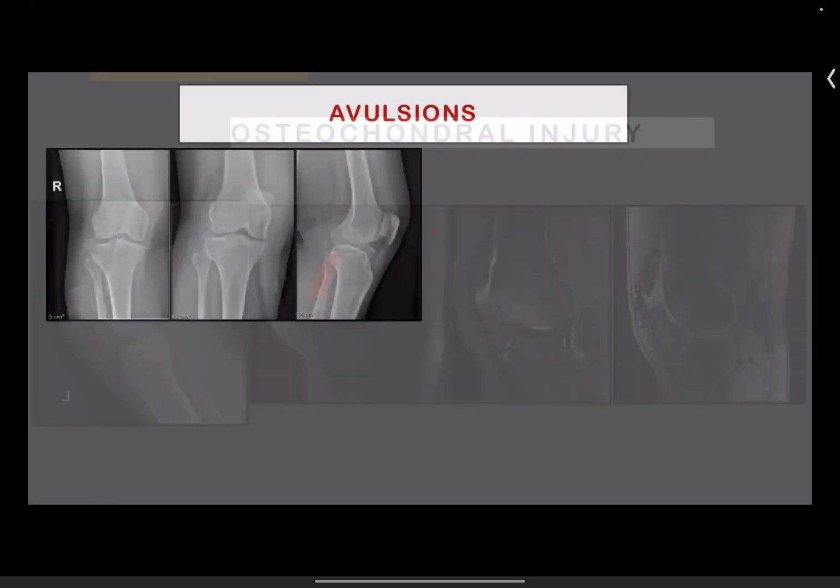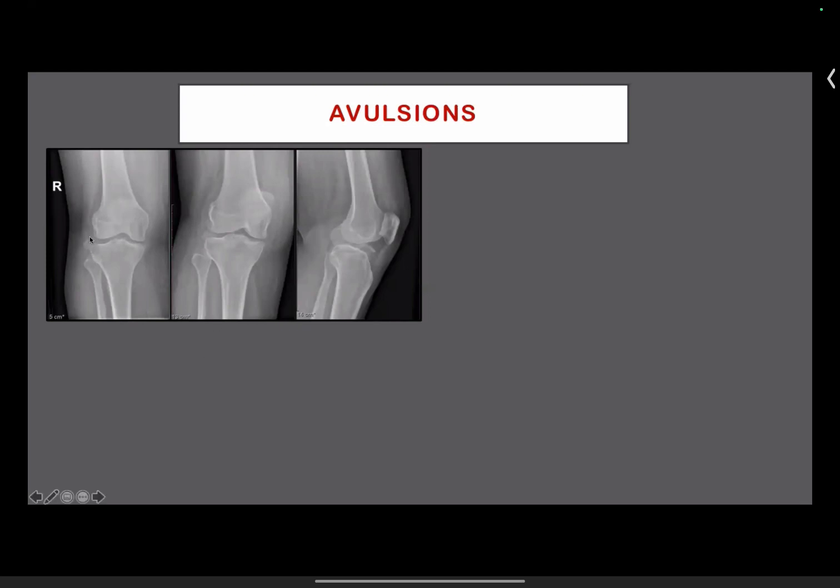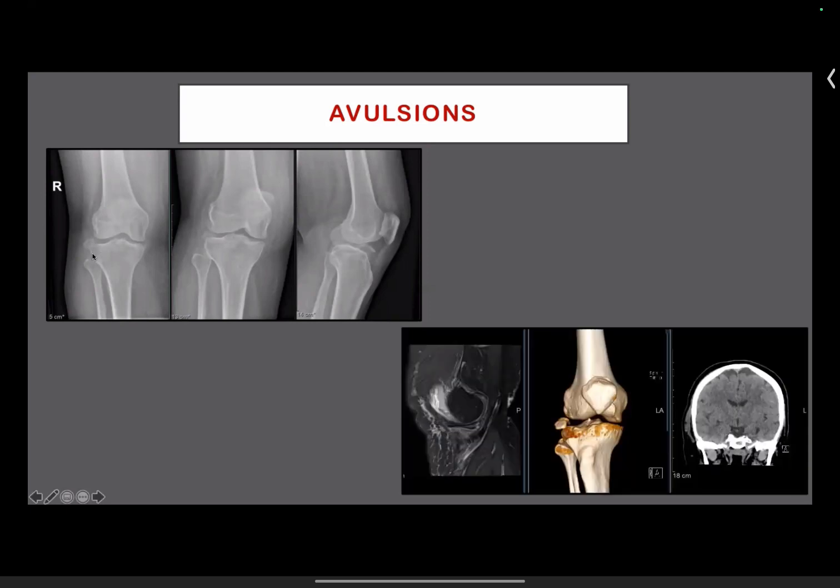So we as radiologists should be well versed with these. Another few cases there you can see. It's much bigger than a Segond fracture. Usually, the location is the anterolateral area, but this is a large chunk there. This is the ITB avulsion fracture. The patient has got some subarachnoid hemorrhage as well.